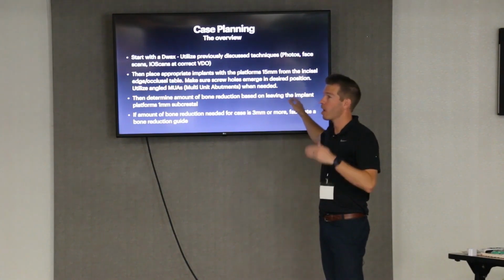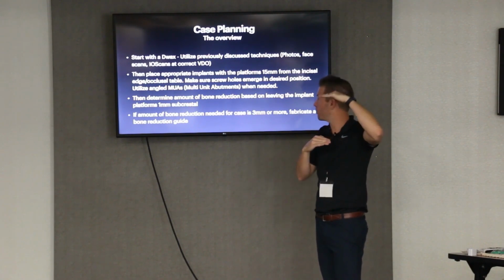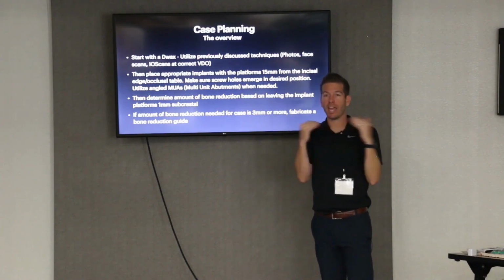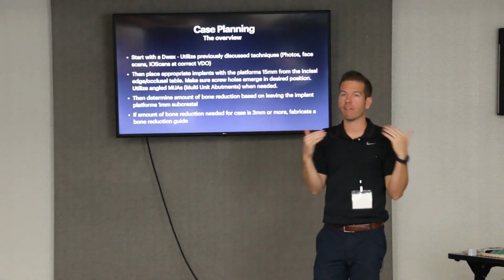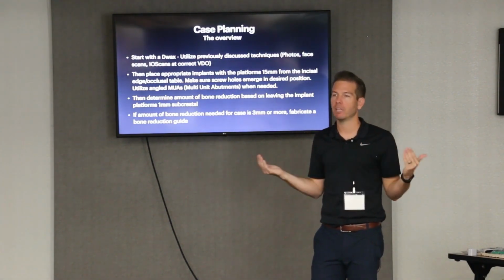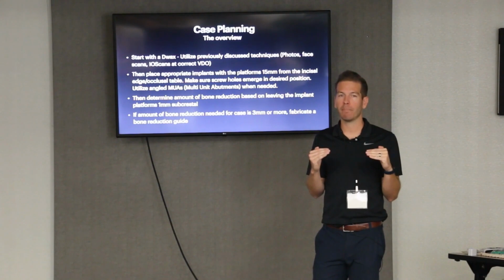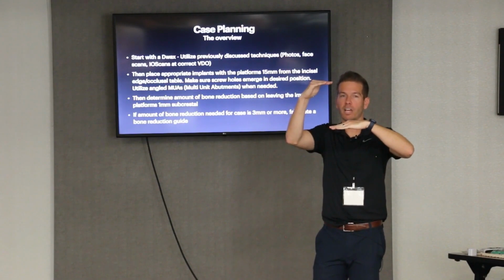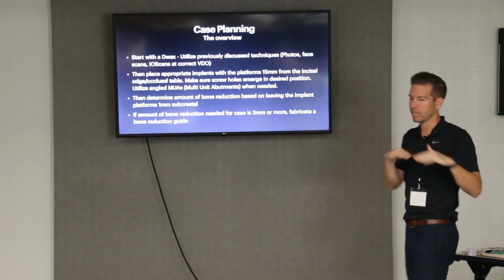So we've got our implants placed now. We've got our occlusal plane. We've got our implant platforms at some given restorative space distance. And then we want our bone to end up at some depth below or above the platforms of the implant. So if you like your implants to end up a millimeter subcrestal, you'd want your bone to end up 1 millimeter past your implant position. So you think, okay, occlusal plane, 15 millimeters from that, you've got your implant platforms, and a millimeter below that, you've got your bone level. So you're just thinking about how you're setting up these different levels and heights of everything.